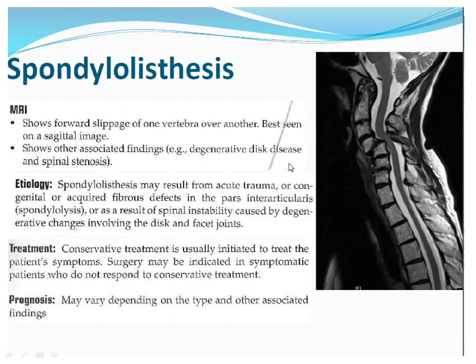Here's another example of spondylolisthesis. This one looks a little bit more like degenerative in etiology. Pretty significant, though. It's causing buckling of the cord. You're probably not going to see it at this level on a usual basis, but it can become quite severe. And in the case of a cervical spine, you might have more symptoms in the upper extremities than in the lower extremities, but they can still have lower extremity weakness as well.